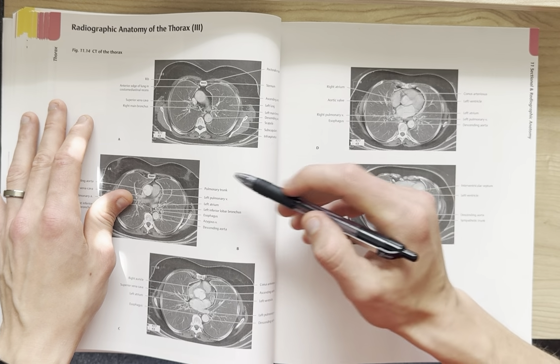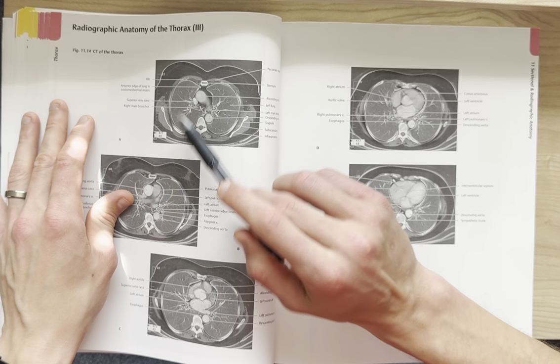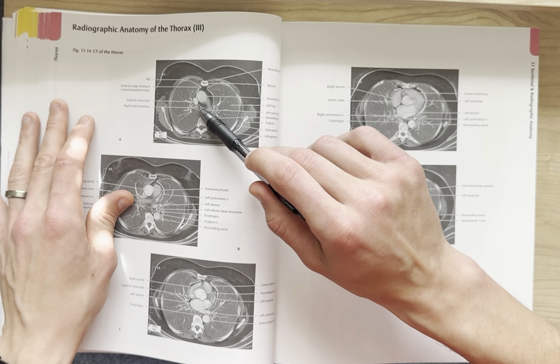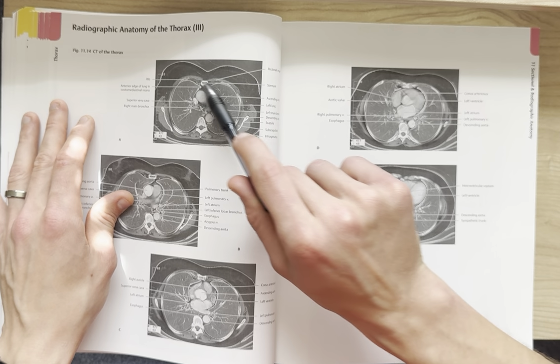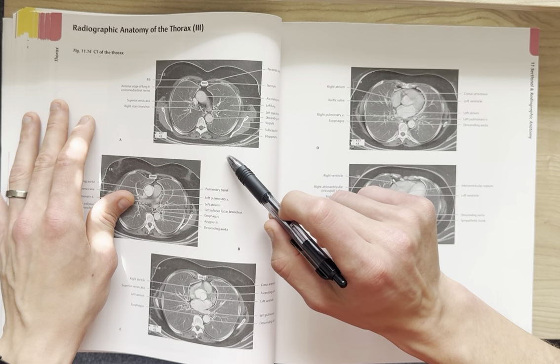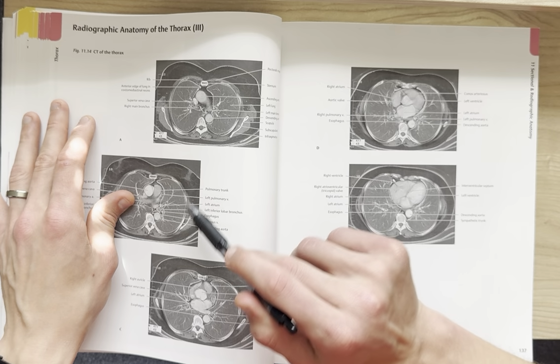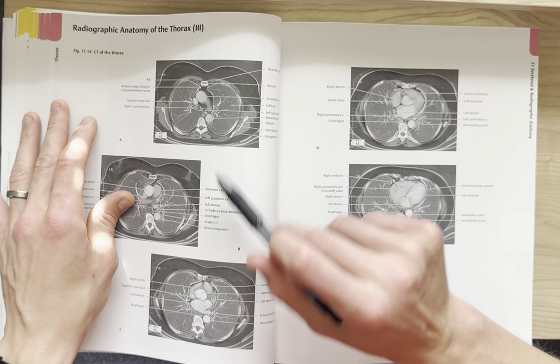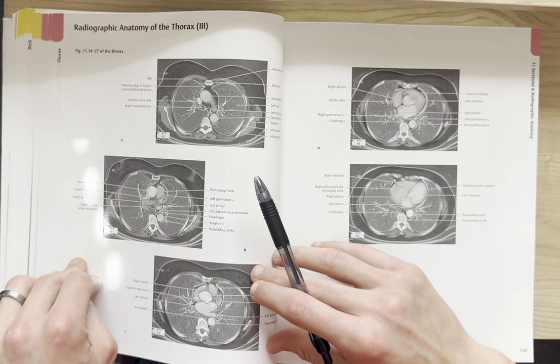So here is our CT of the thorax. We've got a rib here. We've got the anterior edge of the lung in the costomediastinal recess. There's that superior vena cava. And here's a right main bronchus. Here's our pectoralis major, actually. So we get a little bit of the musculature we can pick up on the CT. There's the sternum. And there is the ascending aorta, the left lung, the left main bronchus, the descending aorta, the scapula, the subscapularis, and the infraspinatus. So we're getting some of the musculature in here.